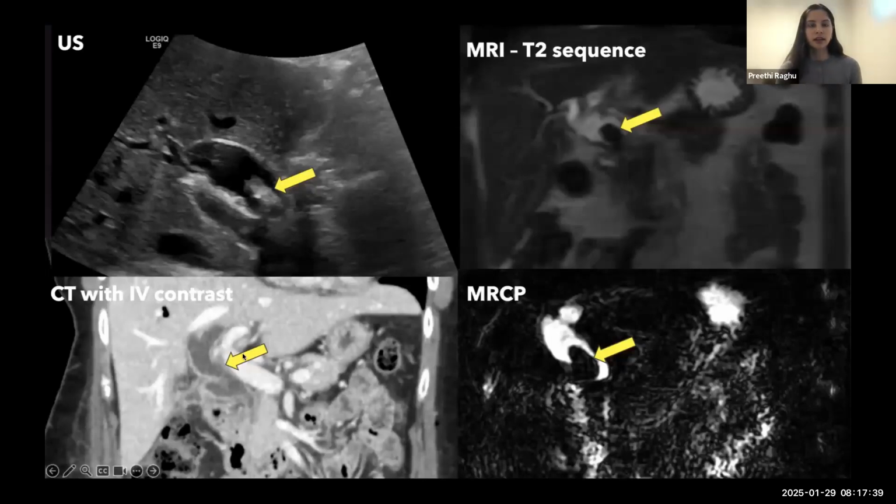And then this patient actually also ended up having an MRI, MRCP, and on MRI, we know this is a T2 weighted sequence because you can see the bile is bright and all fluid in the stomach is bright, and our internal control is to look at the cerebrospinal fluid in the spinal canal. If that is bright, you're on a T2 weighted sequence. So on the T2 weighted sequence, you can see that there is, once again, the correlate to the ultrasound finding: a big duct and then a big low T2 stone sitting there.